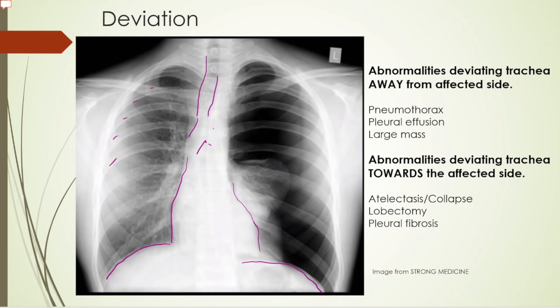But you look over here on the patient's left side and you see really no lung markings. See, there's no vascular markings here anywhere in here. And this is a really easy one to pick out. Some pneumothoraxes aren't. And this one's, again, a tension pneumo because it is pushing the trachea and the heart over to the patient's right-hand side.